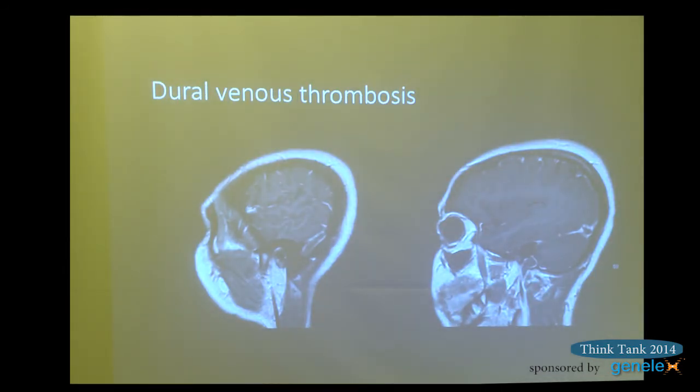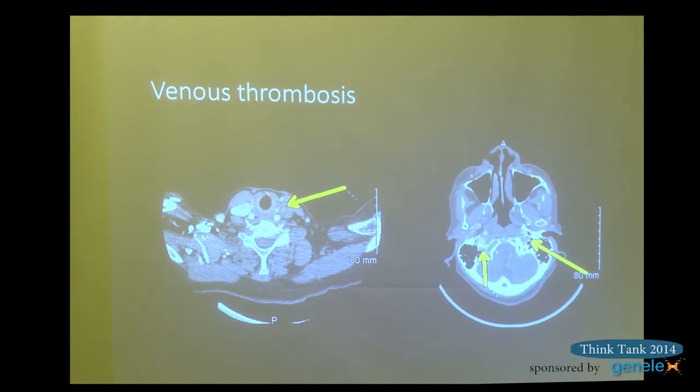Just that on some of the MRIs, is the contrast reasonable there? These are 2 images from this person's MRI of brain with contrast. Normally, this should be filled with bright signal because it would be venous blood. Instead, there's blood clot. This person has jugular venous thrombosis.